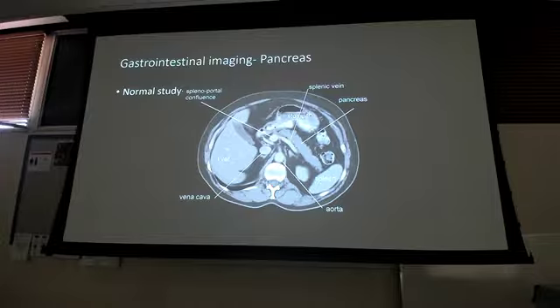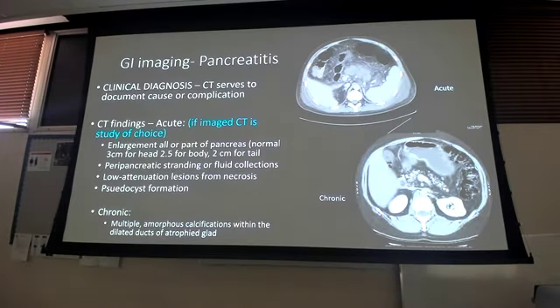CT, you will see it. It is the spongy looking tail-like thing in the middle of the abdomen. And I will tell you right now, this is one of the best pictures you will ever see of a pancreas on a CT, so enjoy it. Okay? There it is. One of the best. They can be really hard to see. Almost impossible even on a CT without contrast, because there's so much that's going on in the abdomen. The contrast really kind of helps pop it out just a little bit.